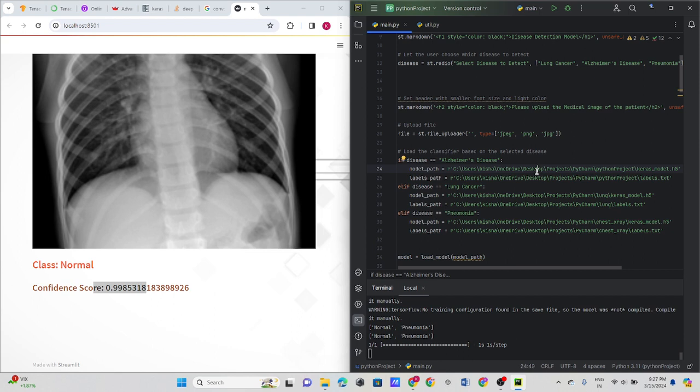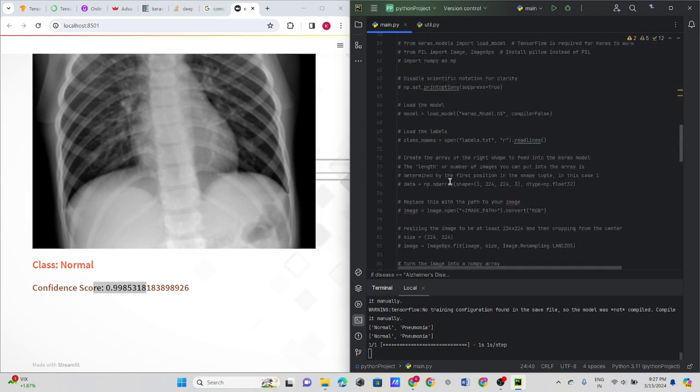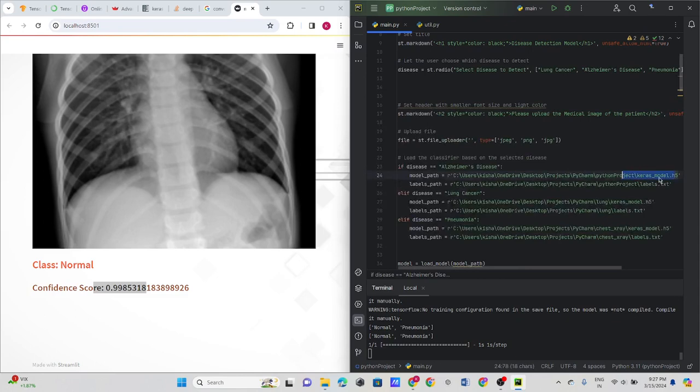It is basically for saving memory. The data stored in HDF5 is not only in the form of architecture, but also in the form of some data stored in there, which may be in the form of intensity or something else. So, what is the implementation of this model path for Alzheimer's disease? It is written here, and this whole text is squeezed into a file known as this keras model.h5 or hdf5 file.